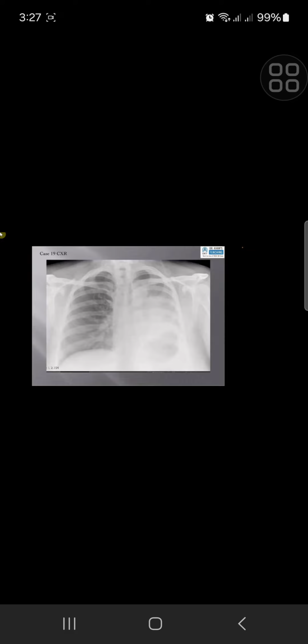In an X-ray of the cervical spine, sometimes you may detect a Pancoast tumor. So the first thing to do in those cases is get a chest X-ray. Keep that in mind. That's quite common sense, and that's what you do if you are sitting reporting a pile of X-rays anyway.